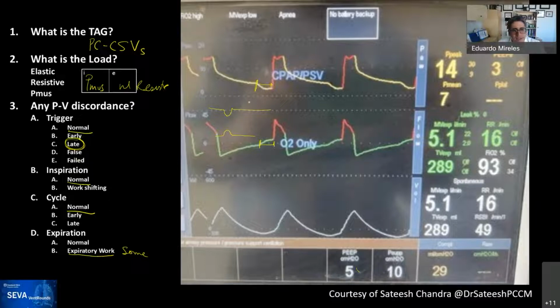Steve, if you had to guess, which one do you think is a trigger? Do you think it's a pressure trigger or a flow trigger? Well, normally you could look at the coloring and the one that's on would indicate, but in the absence of that, the fact that the flow already becomes positive without triggering it means that it's probably more likely pressure triggered. So the opposite, and the reason is, you see how it plateaus here. It actually starts going. There is no more change on the pressure, but the flow continued to go up. And I know this just because Satish sent it on the email to us, but he changed the threshold triggers for flow, so he went higher.